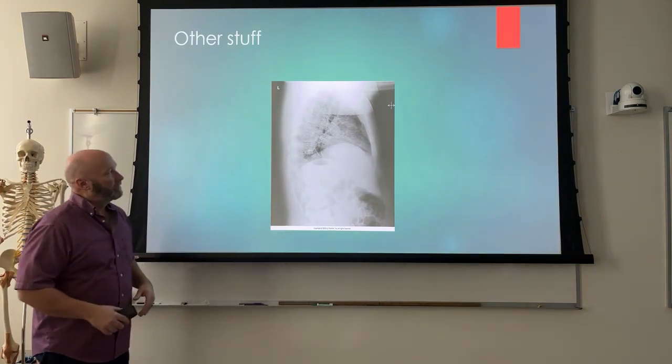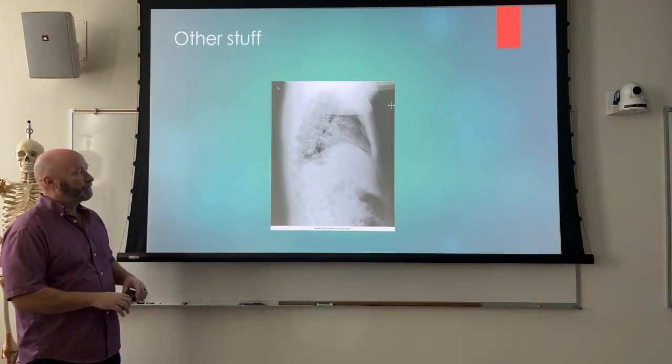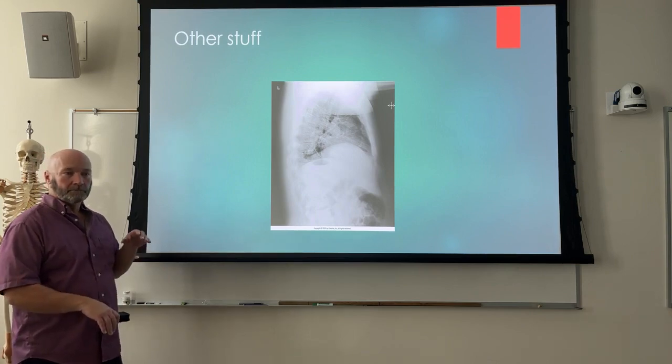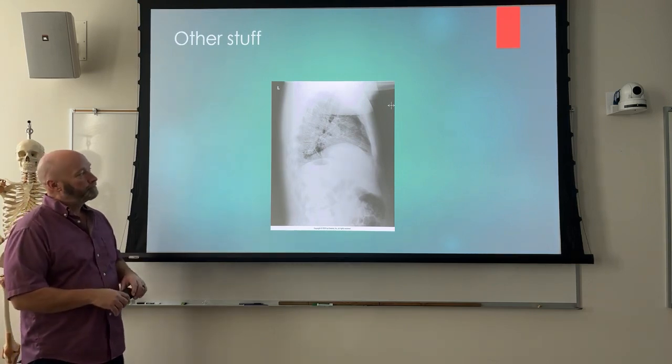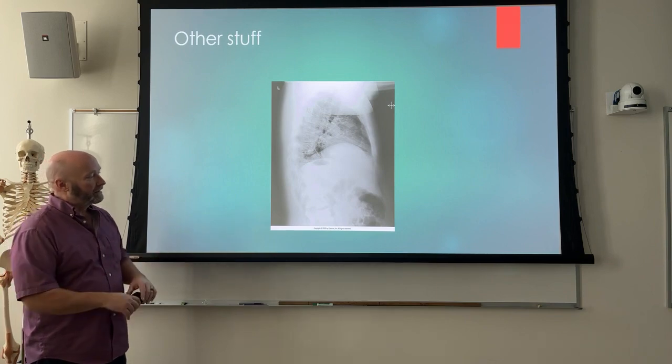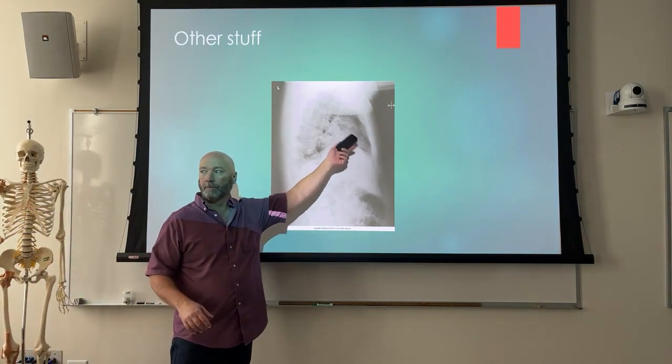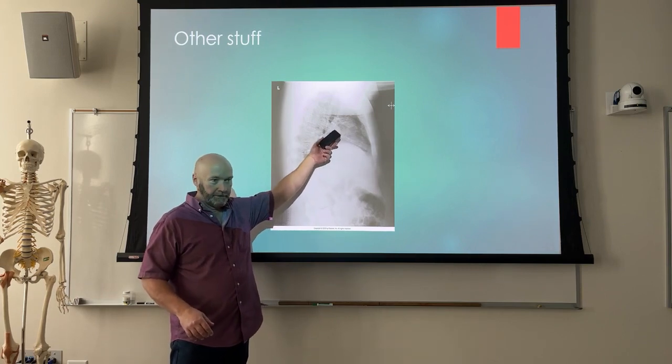So now, what do we see here? The bubble is low. We also have telltale indicators of what we've got going on. Look at how much soft tissue is on that upper arm. That's a big patient, right?